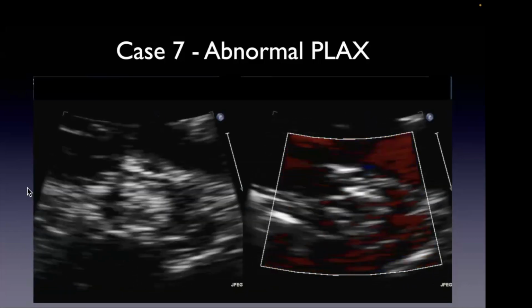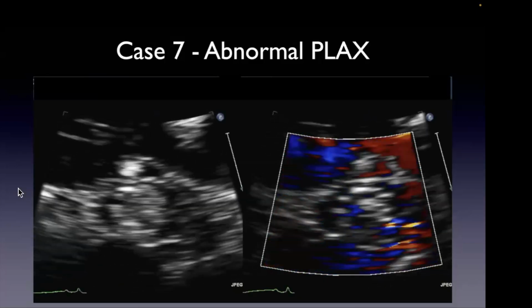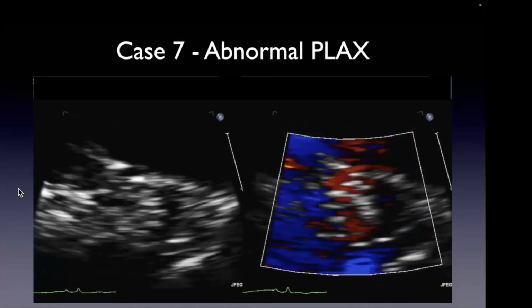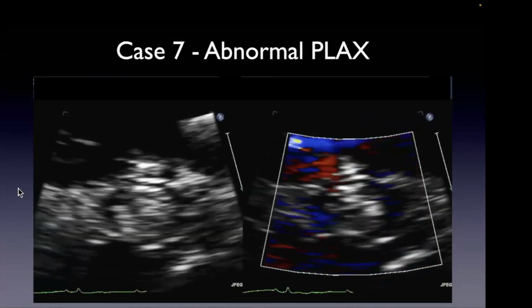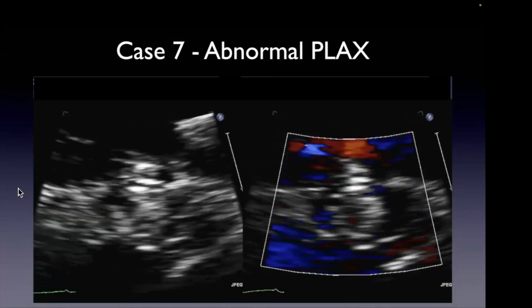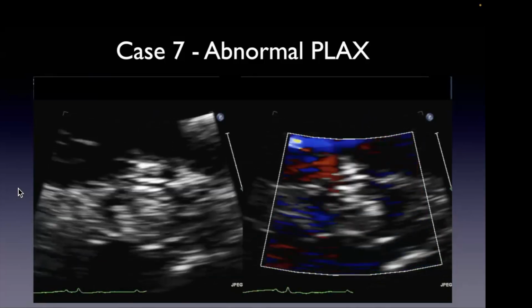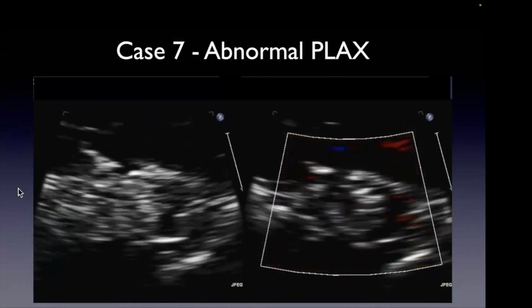And yeah, we tried to do color Doppler. Obviously, there's no flow. So if you wanted to delineate this, what would you do? Contrast. Contrast, yeah, but what kind of contrast are we talking? A carbonated beverage, right? True.